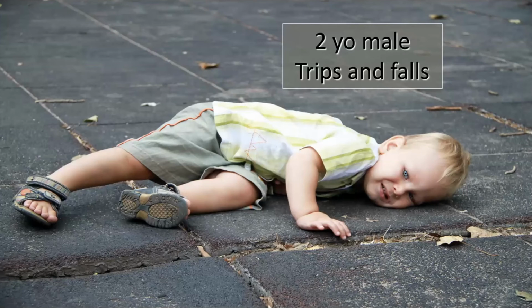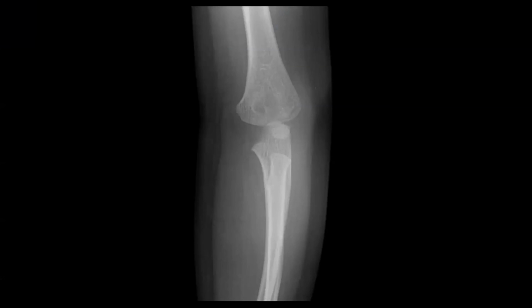All right, this kid comes in, trip and fall, complaining of elbow pain. Pediatric elbows are incredibly hard to read. Even the radiologists don't really like reading them because of all the different ossification centers. When we look at it, I see a lucency here that catches my eye. Again, is that an ossification center that's supposed to be there, or is that a fracture? There's a whole system to go through that I don't have time to do today.